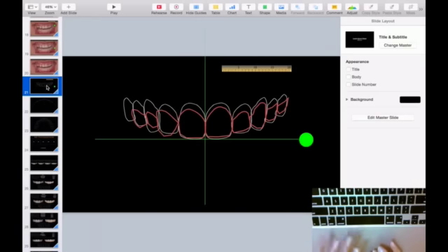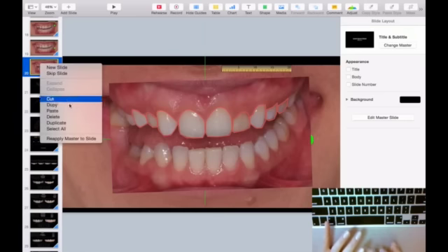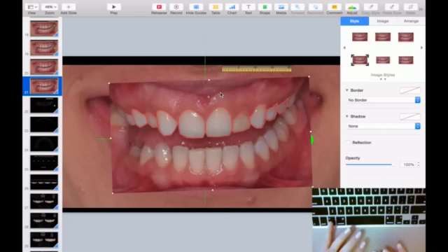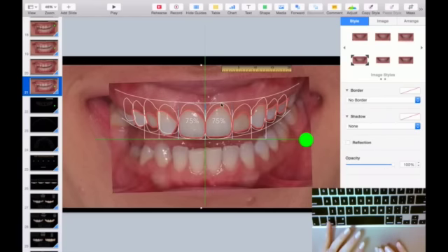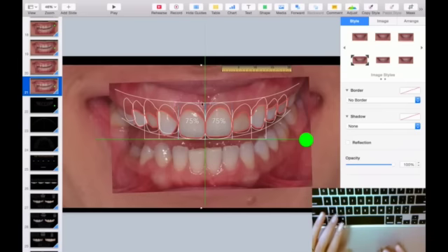Now, also, this picture is extremely important to do our Command Z. There you go. If you do something wrong, Command Z.